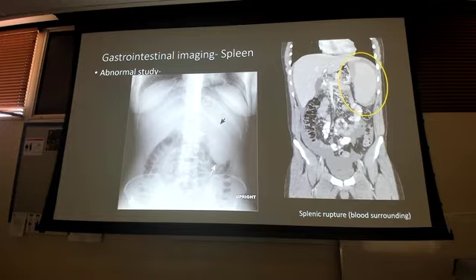And so remember how we talked about how the main organ is going to be a little more highlighted than the surrounding fluid and tissue when you end up having that rupture, kind of like that dissection, right? We have that nice bright white area, and then we had that extra area that we're like, oh, I can kind of see that. That's weird. That was the blood kind of leaking into that other layer. Same concept here. We got blood leaking out around the spleen. And so this is a splenic rupture.